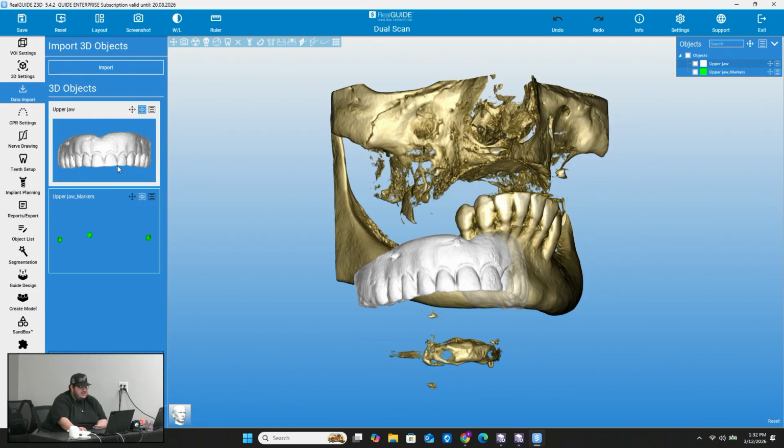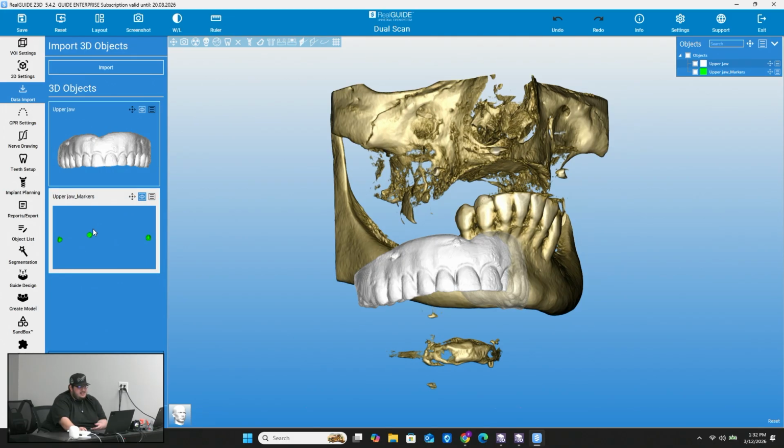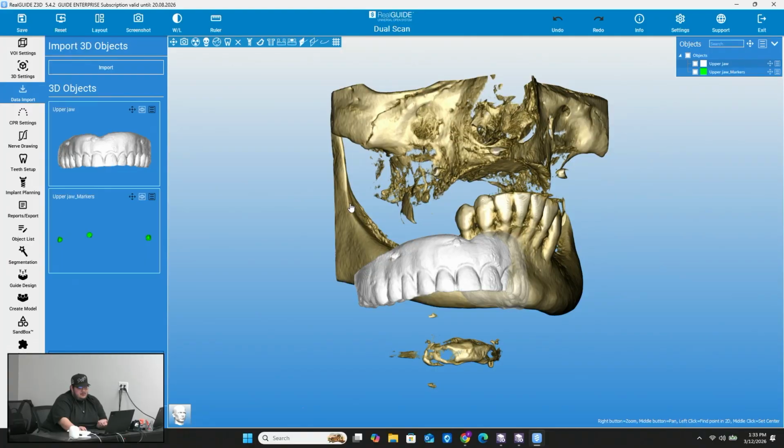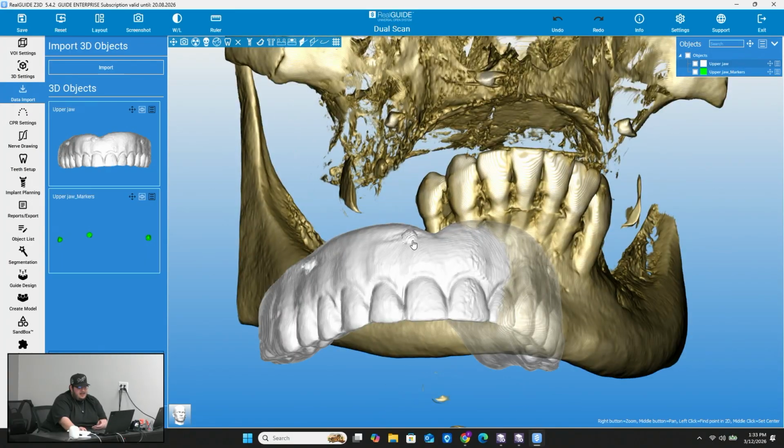So now, as you see here, again, what's really important and really actually cool about not only making a segment or a mesh for the actual prosthesis, but the markers, is because, again, for some markers, when I show the less dense areas, those markers start to create scatter. So for example, for this case, let's say that on this patient's prosthesis, these markers were creating a lot of scatter, just a crazy amount of scatter.